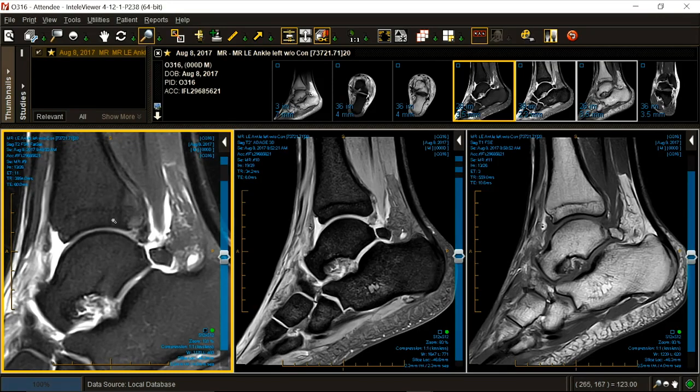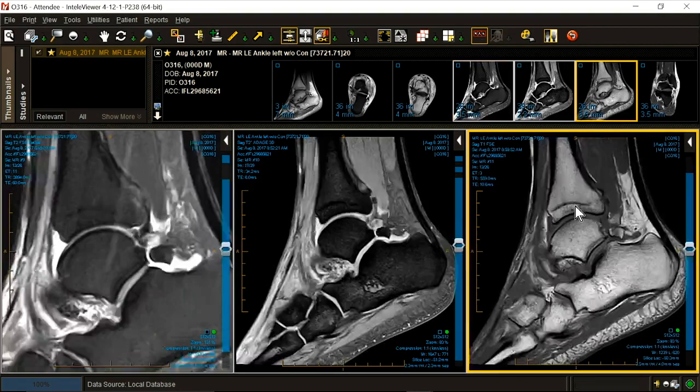But he's not a juvenile. He's a young adult man, a big man. His growth plates are closed. It is not uncommon to see a scar at the closed growth plate for years or forever. Let's keep looking, shall we?